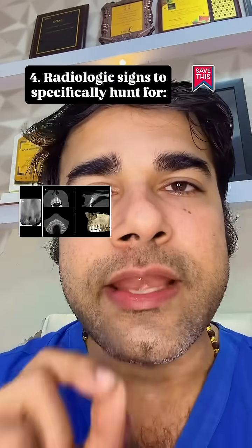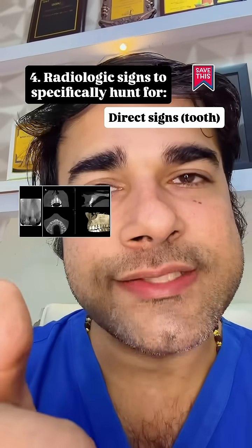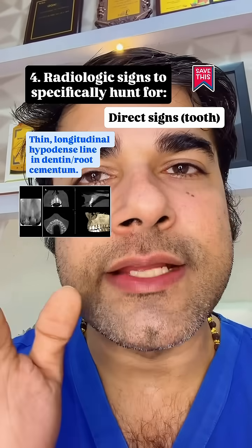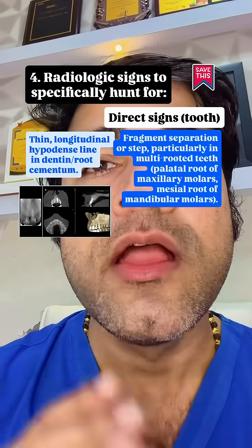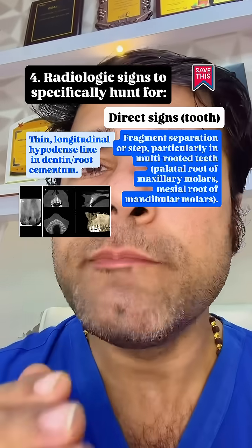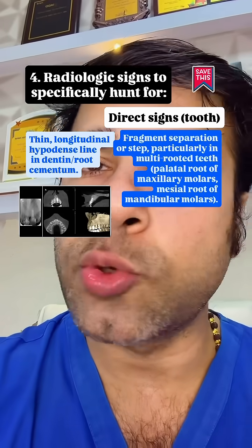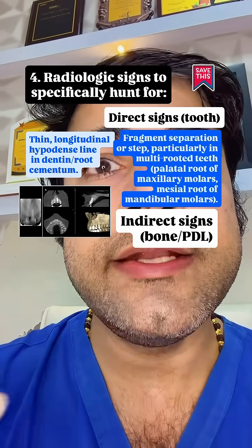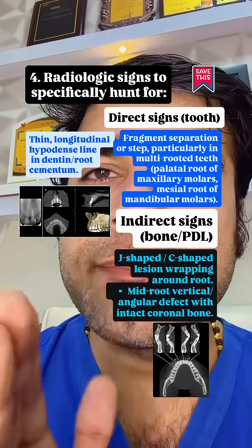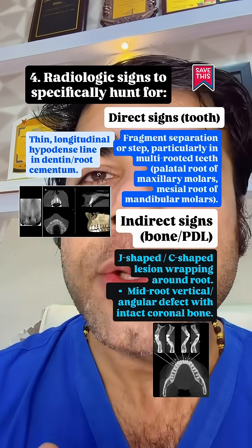Step 4. Radiologic signs to specifically hunt for. Direct signs on a tooth: a thin longitudinal hypodense line in the dentin or the root cementum; a fragment, separation or step, particularly in multi-rooted teeth, the palatal root of the maxillary molars or the mesial root of the mandibular molars.